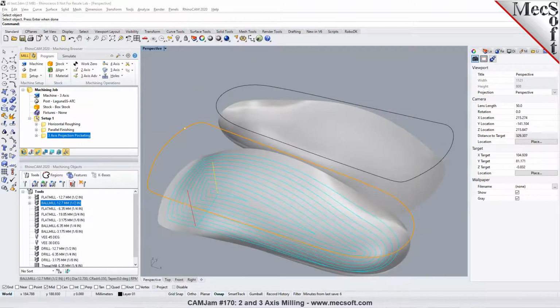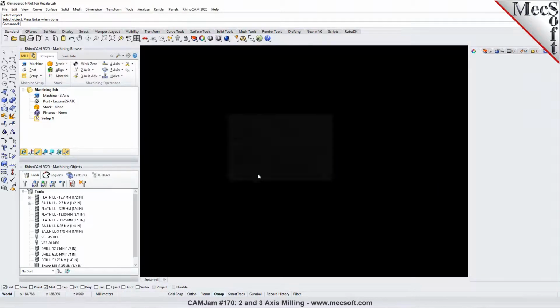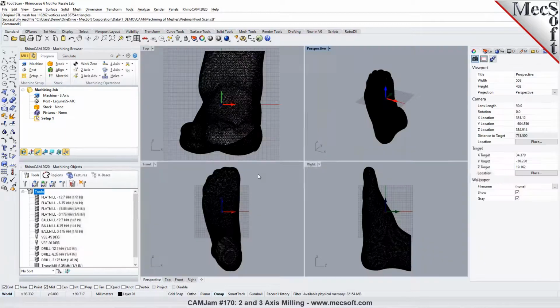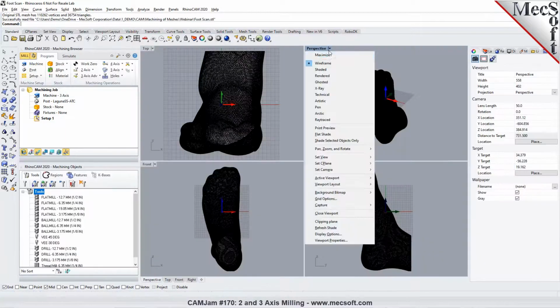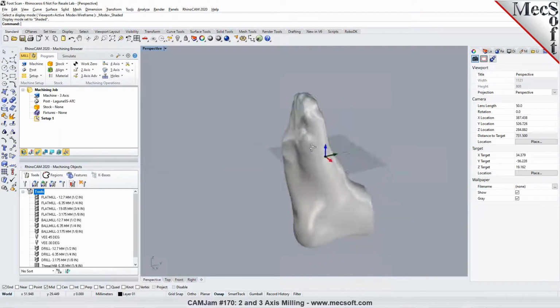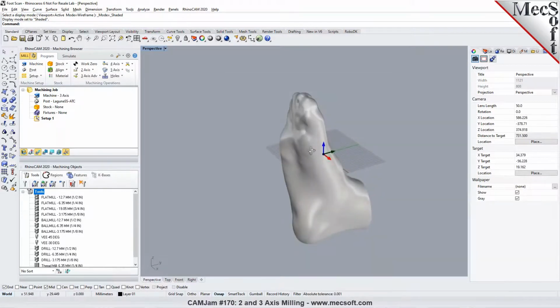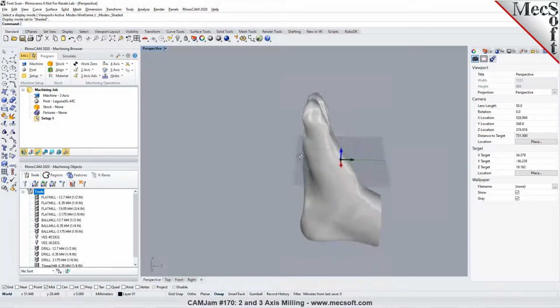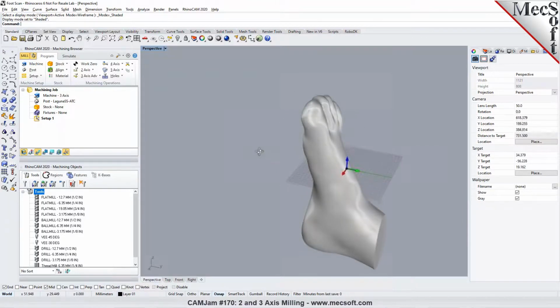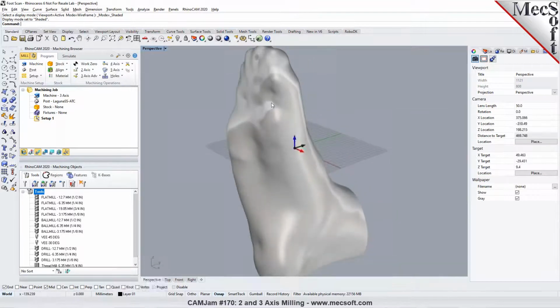Okay, so I'm going to go ahead and bring in an STL sample that I have, which is actually the model of the foot itself. Okay. So you notice that, sir? Yep. Okay, so would it be something similar to this you're looking to machine? Yes. Obviously just a planar surface of it. Okay, you mean the bottom here?